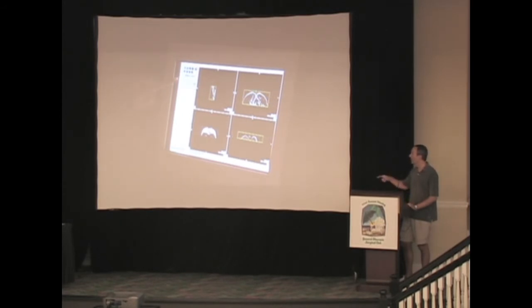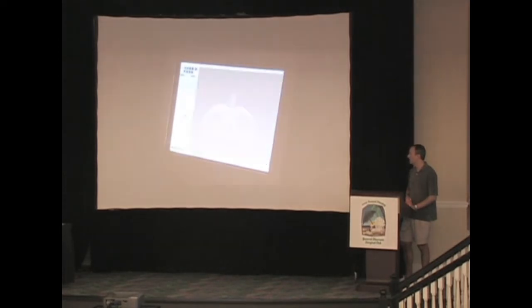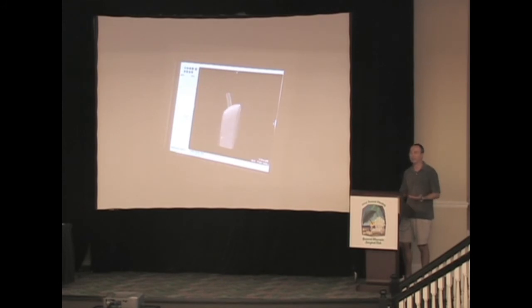She's going to go down to the lower left quadrant. She's going to mag the image. And then just to get a better view of it, she's going to pop it to make it go one-on-one on the screen. So just really within 30 seconds, we've got a 3D image of the trachea. It can be looked at by the radiologist, the surgeon, pulmonologist, and so forth.